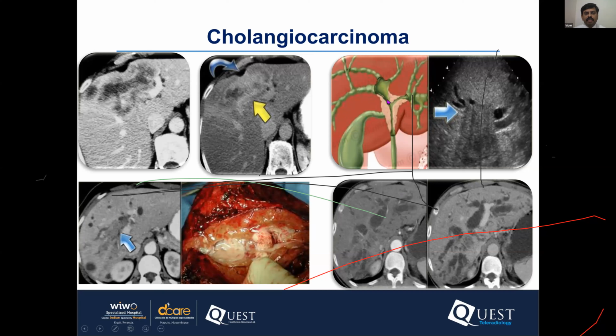Here, this is a classical tumor of the hilar cholangiocarcinoma, which is obstructing at the level of the junction of the bilateral main hepatic ducts, the right and the left, and the common hepatic duct. And this will be causing a dilation of the entire proximal biliary tree and severe jaundice. And most of the time, when the diagnosis is made, it is already an advanced stage, and the patient needs immediate palliative treatment. So with this, I conclude the walkthrough of the pictorial review of the hepatic and the biliary system.